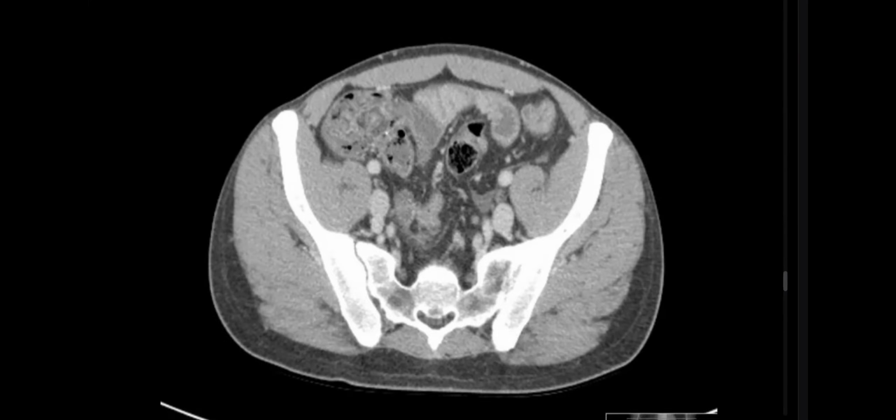Good. I should examine other organs, and also, I talked about the pneumoperitoneum, and I should also examine other organs for any association: the previously mentioned gallbladder stones, the perianal fistulas, sometimes the autoimmune cholangitis, and also the bone for the sacroiliitis.